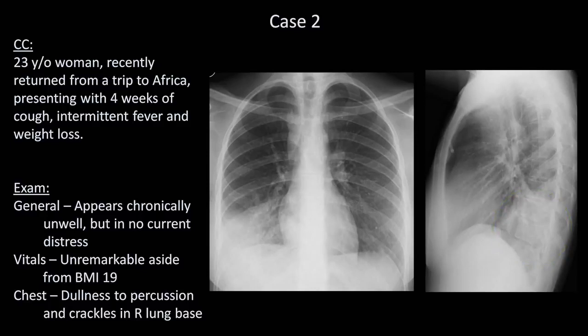This is a great example of the spine sign, in which there is an interruption in the normal progression to increasing lucency as one moves inferiorly down the spine on the lateral film. In addition, this opacity is well defined and dense enough to be referred to as a consolidation. On the PA film, if you examine this area more closely, I think you may be able to make out an air bronchogram.